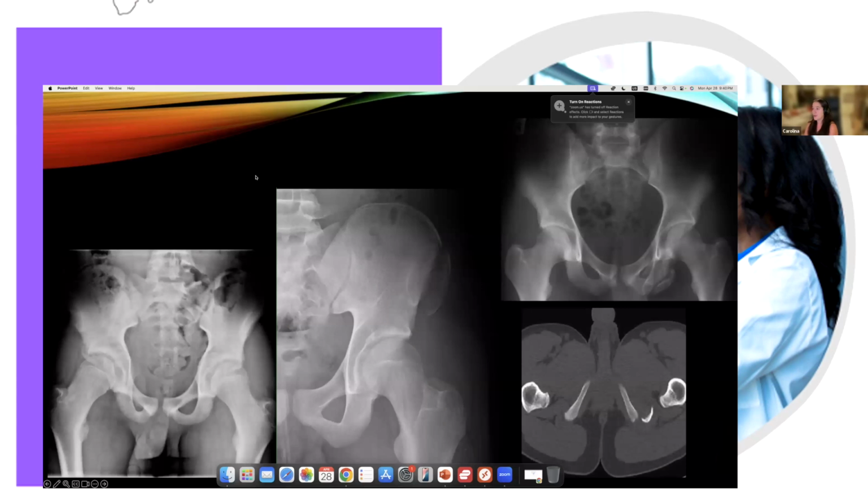Now, it's not only acetabular fractures, we also have lots of avulsion fractures that we can miss, especially if we're not paying attention. Some are very subtle, some are very small pieces. Avulsion fractures tend to happen whenever you have a very strong tendinous attachment into different bony protuberances, which is where the tendons attach.